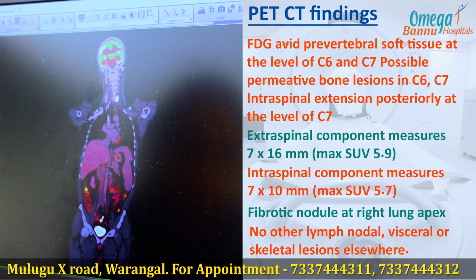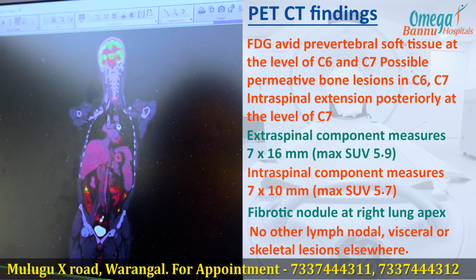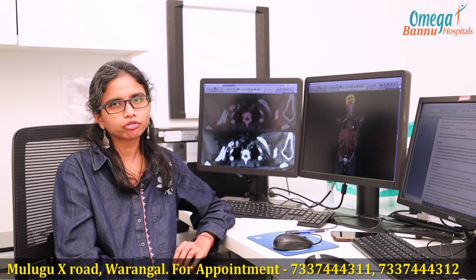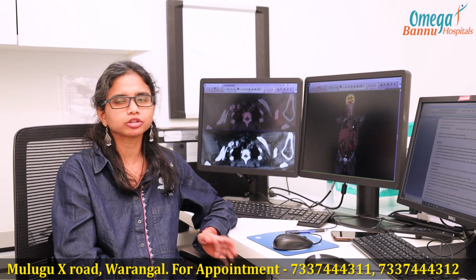Biopsy and histopathology from the metabolically active prevertebral soft tissue component will solve the puzzle in this case. Most likely it looks neoplastic. A proper biopsy and IHC correlation is needed to rule out possibilities like lymphoma in this case. This case highlights the importance of detecting a lesion in this patient with cervical radiculopathy, and a proper biopsy and IHC will give the correct diagnosis and further management.